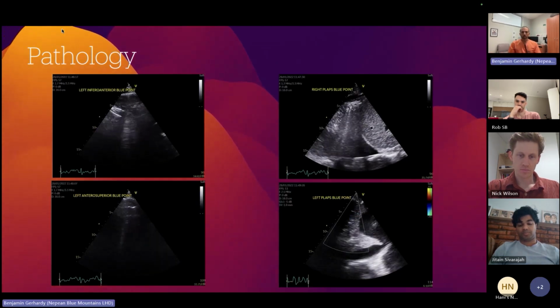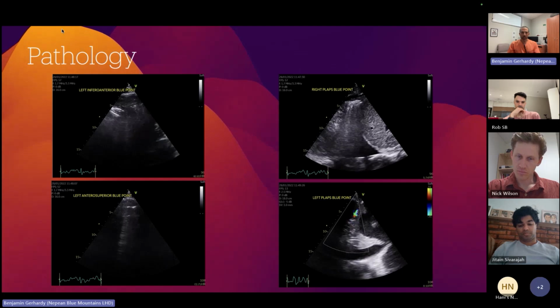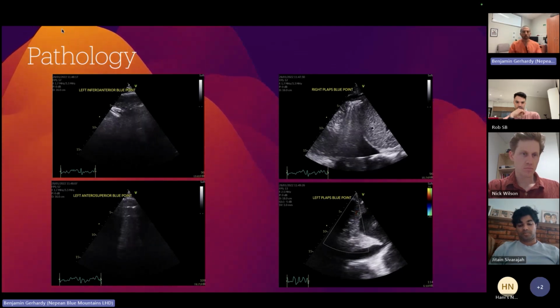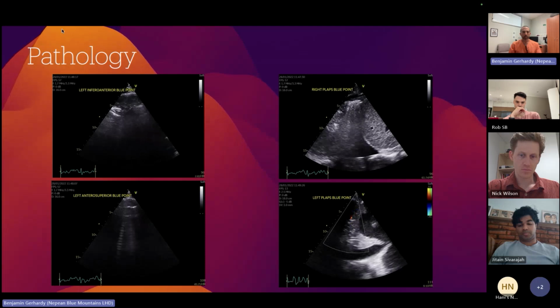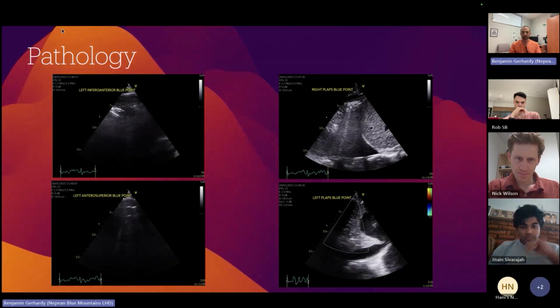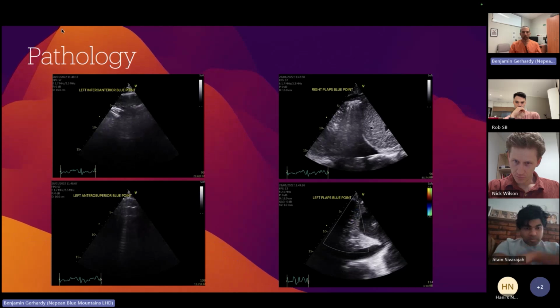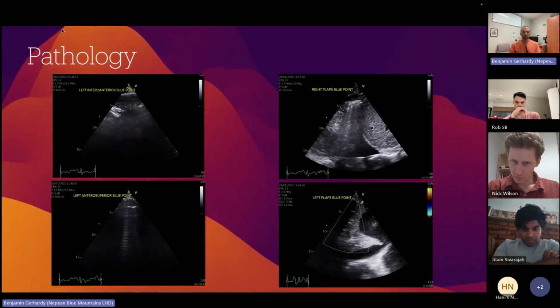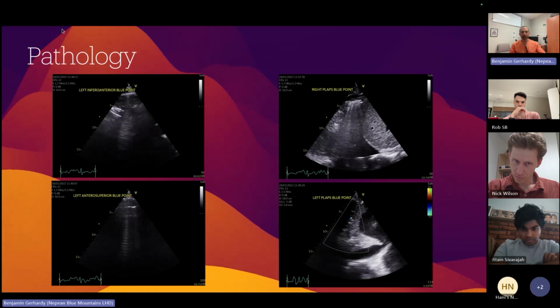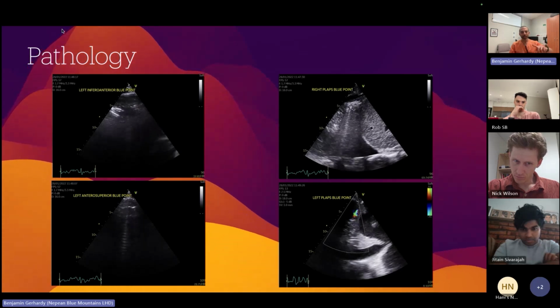So this is just one example. Hopefully it's projecting all right. These were some images from a patient whose images are now being submitted for a case. So it's all been labeled pretty well. It's got left, infero-anterior and antero-superior. I guess anatomically speaking, I should have the bottom on the top.